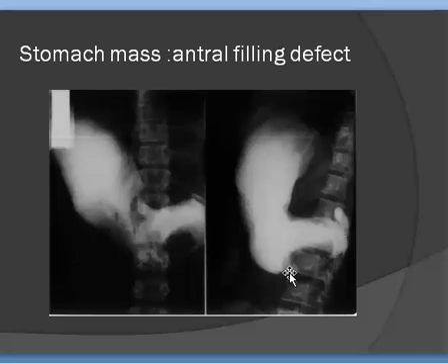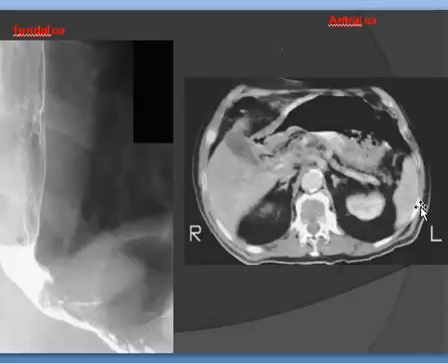This is the region of the antrum, and here we find an annular filling defect that appears as if there is annular compression by a fist of the hand. This is due to a mass, gastric carcinoma. A fundal carcinoma can appear as a soft tissue shadow against the air within the fundal gas bubble, and this is the thickness of the subdiaphragmatic region, which is increased with irregularity and shouldering at the esophagogastric junction.